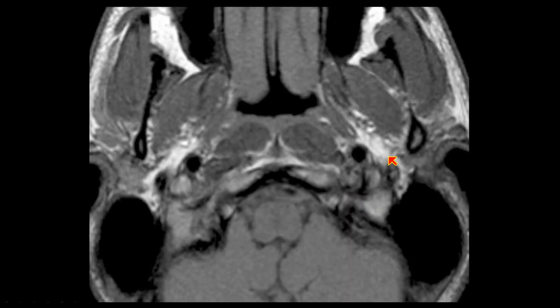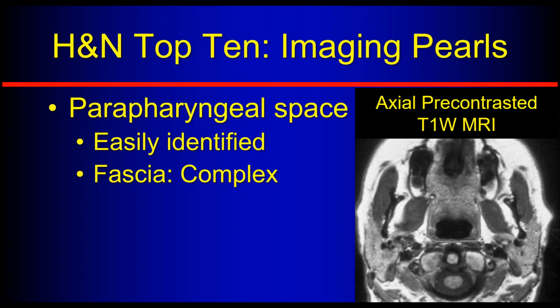Here's just another picture where it shows the importance of the parapharyngeal fat crawling up the skull base. And it's very important to see where that fat is and how it's displaced. And we talked about that a little bit in the suprahyoid neck. I want to find that parapharyngeal fat and see how it's displaced on the axial T1 images. Those are very important. So here I've outlined the parapharyngeal space with that complex fat.